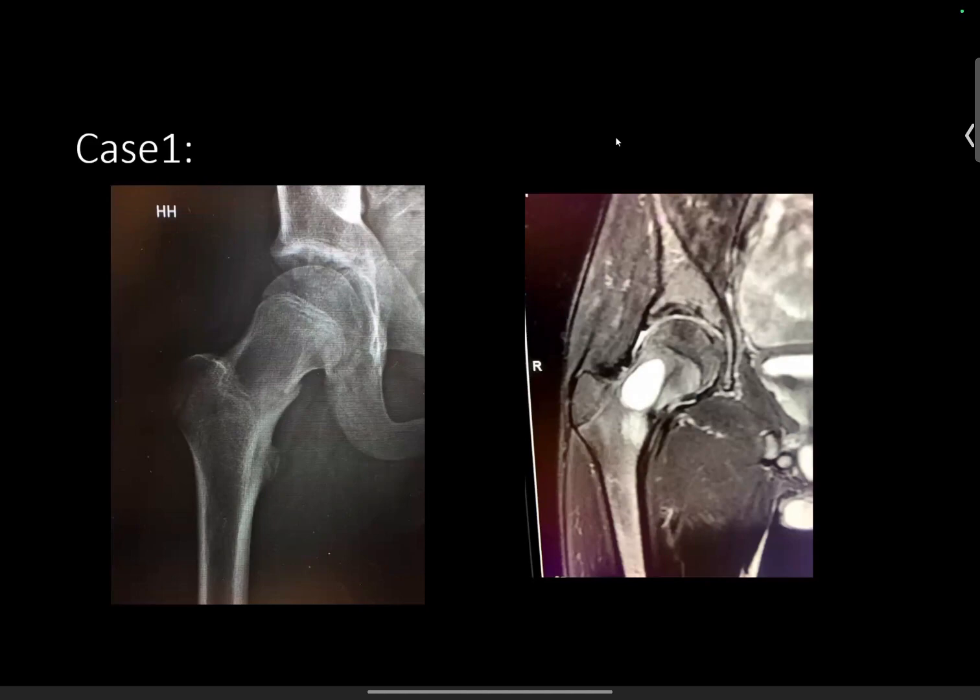Okay. I am going to now open this up here. So I have my chat open. And what I'm going to ask you to do is not only just say the diagnosis, but we're going to try to use the Samet method here to describe this lesion. And I'm going to do this one first here, but you can say the answer.